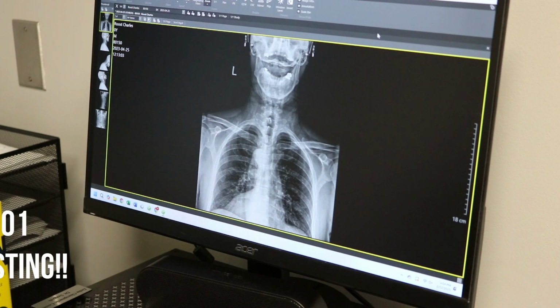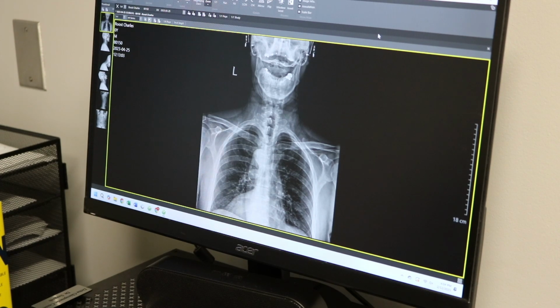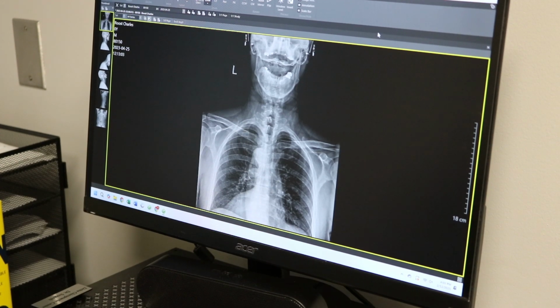All right, Dr. Sagish, these are x-rays that were taken recently, about a year ago now, of me, Dr. Roost, about 10 years after I was in a car accident in which I broke my neck in 3 places. So I would ask you if you would just go through all 6 views and tell us, kind of overall, what you see on these pictures.